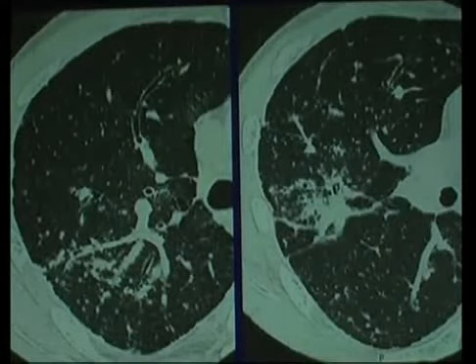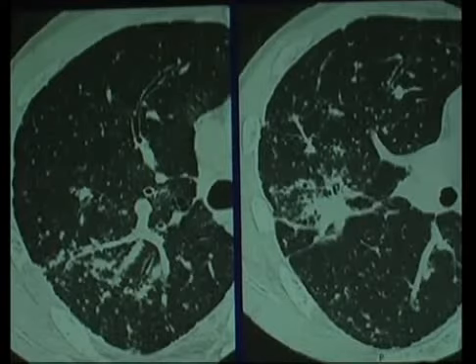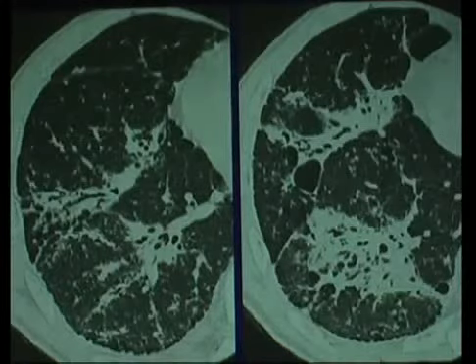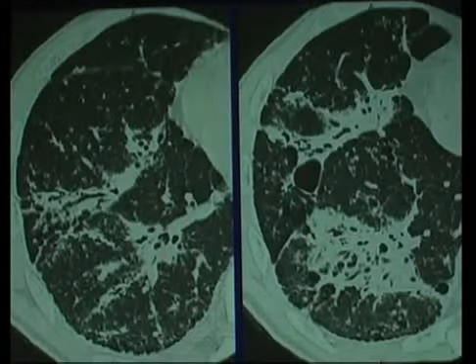Sometimes these things can coalesce into larger masses, can almost look like progressive massive fibrosis with these big, large masses that occur in the upper lobes. And you can have these break down. Occasionally, cavitary sarcoid is something to be concerned of. So you get these kinds of more fibrotic changes, but they don't really look like the IPF cases I showed you upstairs. So where are they?